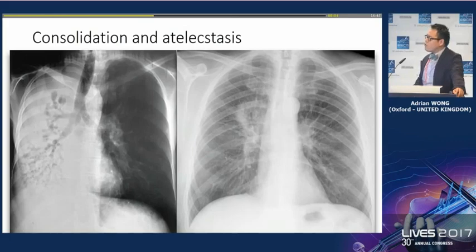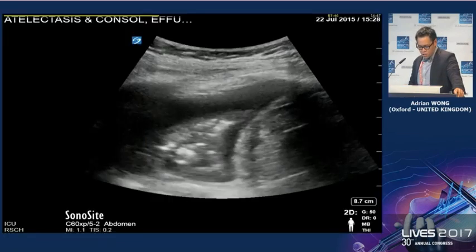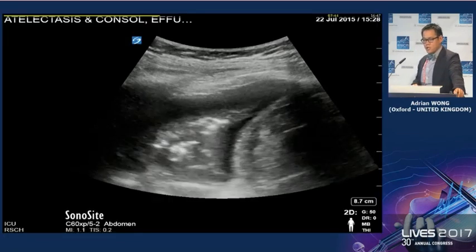Consolidation. Fortunately, I'm hopeful that we don't get x-rays such as this one here on the left-hand side very often. We often get chest x-rays that look like that. Someone say, is there increased shadowing? Is there not increased shadowing? I'm not quite sure. But with lung ultrasound, you can see it again in real time.